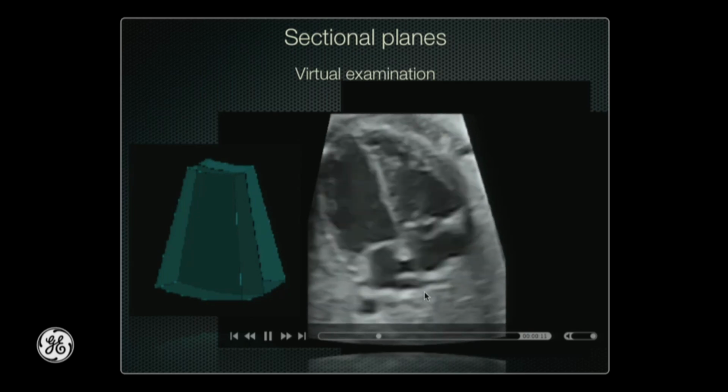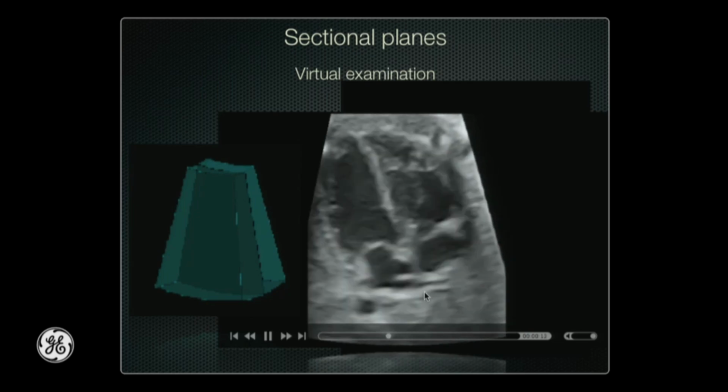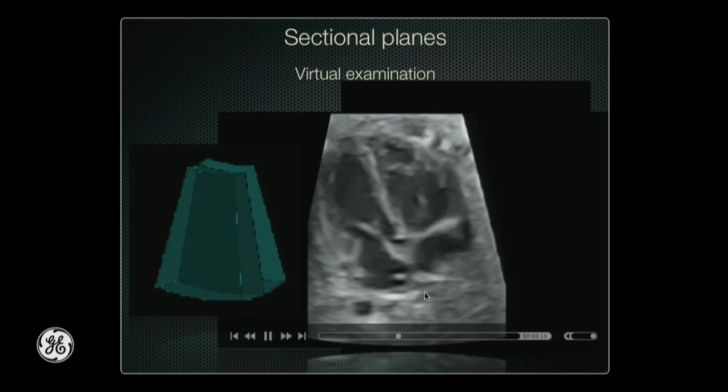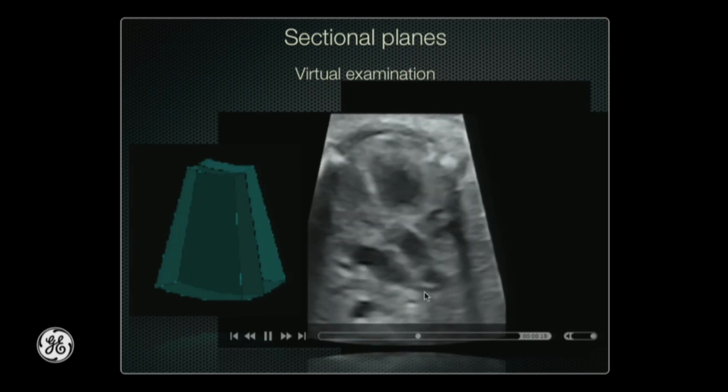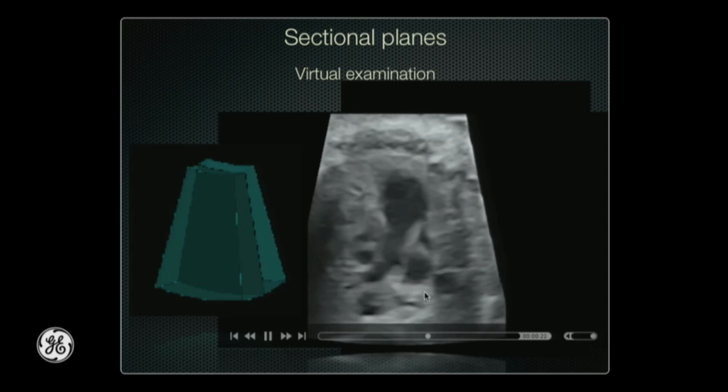So for teaching purposes, we use it always when we perform fetal echo courses, and we train our pupils for fetal echo using this multiplanar imaging.